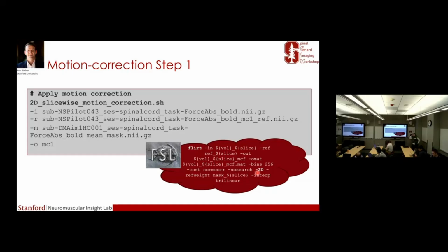And I used SCT fMRI moco, for example, which also allows the 2D option with some constraints, I think based on curvature, and that worked well for me too. Yeah, that's from the SCT. I think one can also play around with different options.